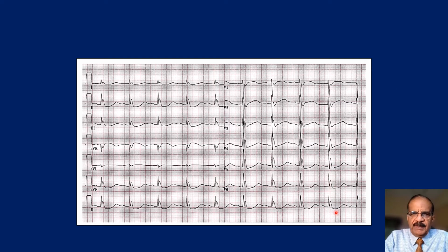Now, this is the ECG. There is an abnormality which you can appreciate if you see this like we normally do: 1, 2, 3, AVR, AVL, AVF, then V1, V2, V3, V4, V5. This is something which is very unlikely in our country because this is related to ambient temperature. Of course, we also have cold weather and some parts of the country which have minus 10 degree temperature, but most of our country is very warm, so it is very unlikely to see this abnormality. But of course you need to know.